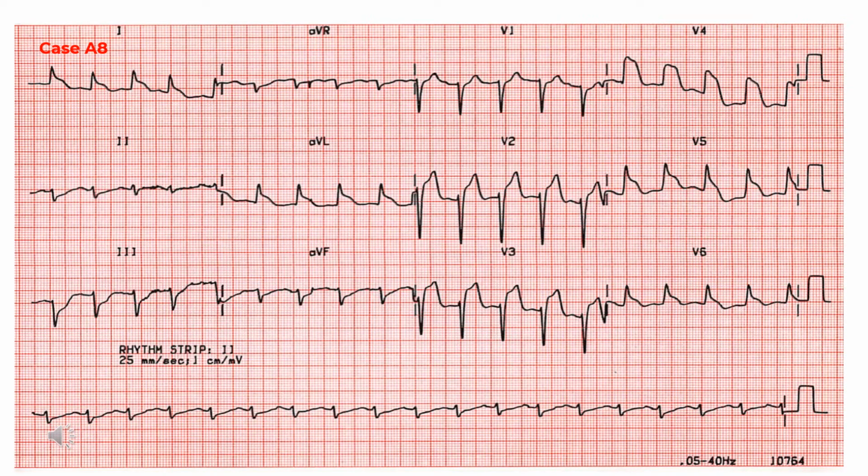Case 8. The ECG shows extensive ST elevation in leads I, AVL and V2 to V6. There is reciprocal ST depression in leads 2, 3 and AVF. At this time there are no pathological Q waves. The pattern of R wave progression is abnormal. The R wave in V3 is smaller than the R waves in both adjacent leads, V2 and V4, suggesting infarction at some time, but it is impossible from this record alone to be sure whether this is recent or the result of previous ischemic damage.